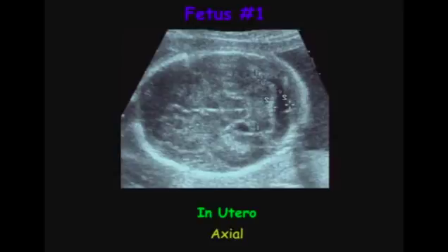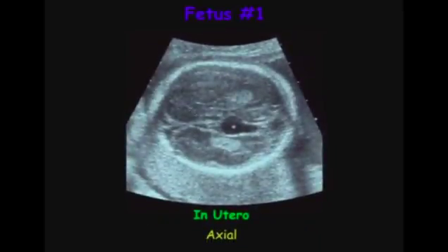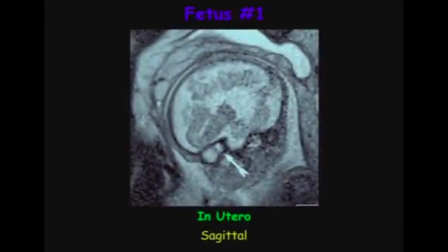Here's another fetus, kind of scary because the cisterna magna looks great, but remember how we said that you can see the cavum septi pellucidi on that oftentimes, but on this one, we're not seeing it up here. Here's the high-riding third ventricle, not the cavum in front. And then notice that we have T2 hyperintensity posterior to the globe.